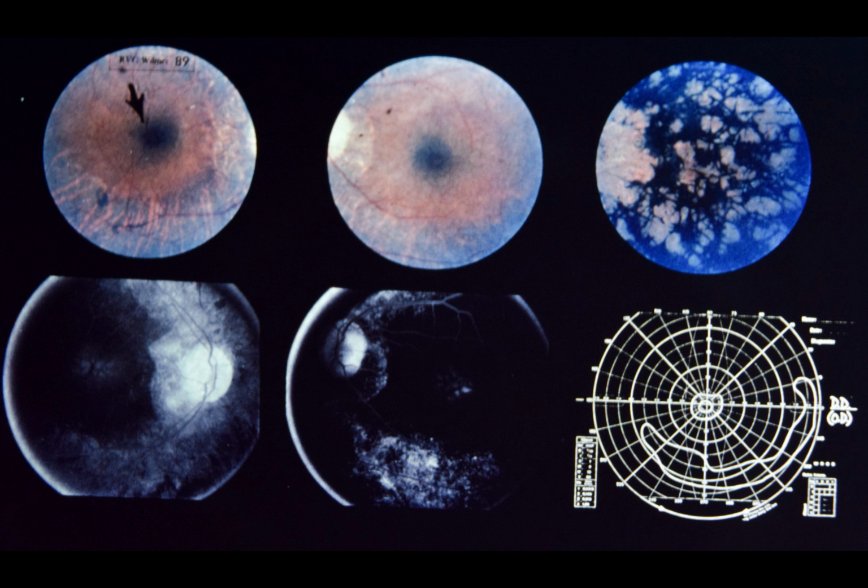Upper left, note cystoid space in right macula, extensive pigment loss surrounding macula, and pigment migration into the retina above inferotemporal vessels. Lower left, note cystoid macular edema 30 minutes after dye injection. Upper center, note temporal disc pallor and subtle cystoid changes in macula of left eye. Lower center, cystoid maculopathy is readily appreciated on fluorescein angiogram 15 minutes after injection.